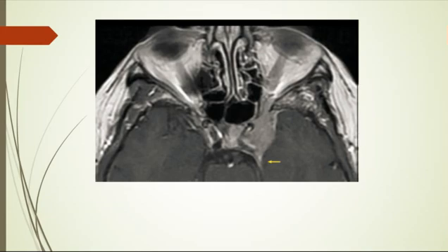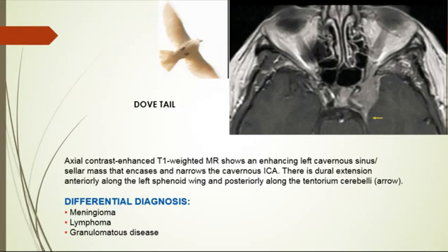What's going on? It's a dural tail. Some people call it dove tail. Dove, kind of a bird. Okay, this is the dove tail sign. It's almost the same as dural tail.